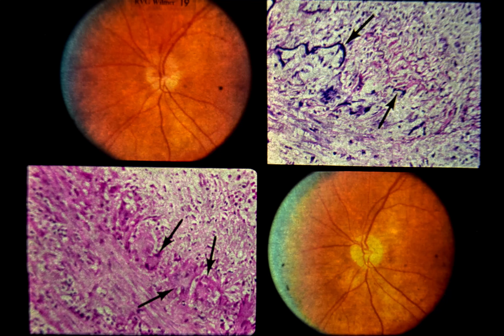involving fixation. Upper left. The left optic disc is hyperemic, with hemorrhages superiorly and pallor inferiorly. The retinal arteries show generalized and focal constriction. The patient's sedimentation rate was 68. She was immediately started on high-dose systemic steroids, and a temporal artery biopsy was performed.